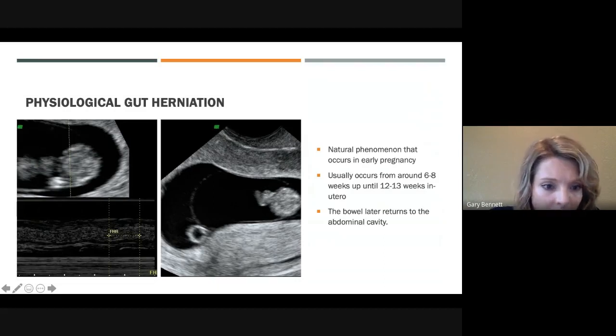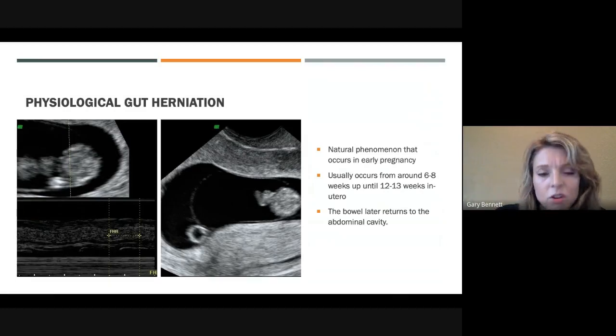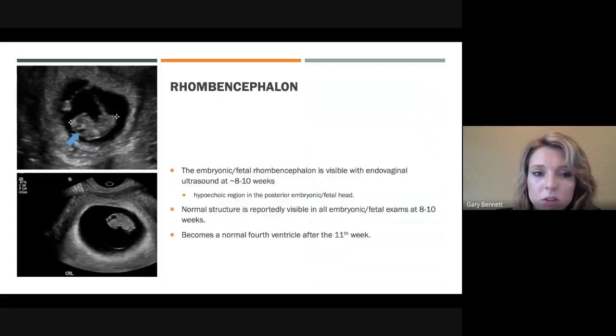And this is a nice measurement of the fetal heart rate. I don't know, it's not super easy. This isn't one of my pictures. It's kind of hard to see the fetal heart rate there. But picking them out on these still images is a lot harder than seeing the heart rate yourself. When you're obtaining it, it's a lot easier to watch for the changes on the M mode and pick up the heart rates on there. It's easier than finding someone's study later.